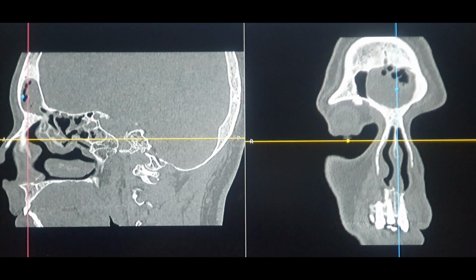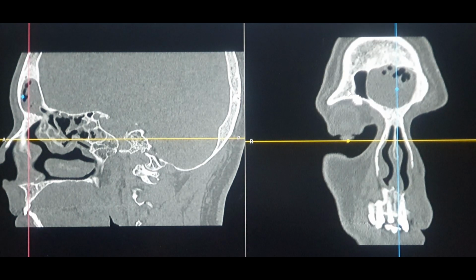Now this is the entire area of the frontal sinus, because as I keep on saying in my lectures, so far as you can see the frontal floor, it is still the area of the frontal sinus. So as you can see over here, this is the area of the frontal floor. That means it is also called the frontal beak.